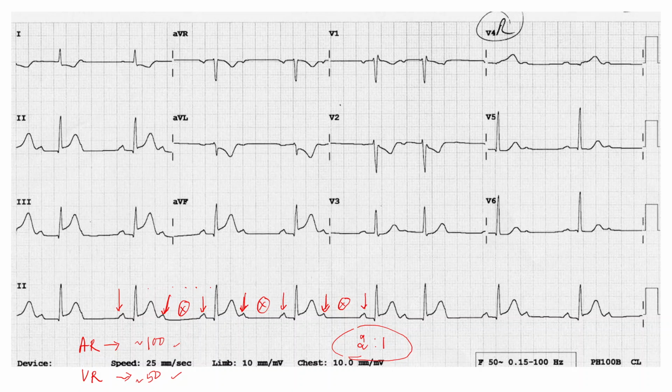So in this ECG, it is very difficult to tell whether it is a type 1 block or type 2 block. But however, not in all cases you will be able to tell, but in some cases you might think it is more likely type 1 or type 2. I'll be discussing that later. After telling you about type 2, I'll be telling about this ECG and what is the most likely diagnosis. Most likely, but you cannot tell 100% that this is type 1 or type 2.